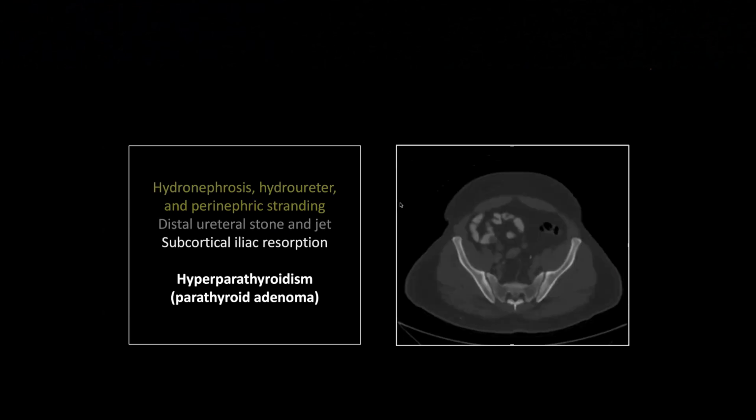So here are the sacroiliac joints, and note, we don't have the thin pencil line of normal cortex. The cortical line there on the iliac aspect of the sacroiliac joints has become fuzzy and blurred, and compare it to the opposite side sacral cortex, which looks essentially normal. So the joints appear to be slightly widened, and note, these changes are predominantly in the anterior aspect of the sacroiliac joints. That's the synovial portion of the sacroiliac joint.